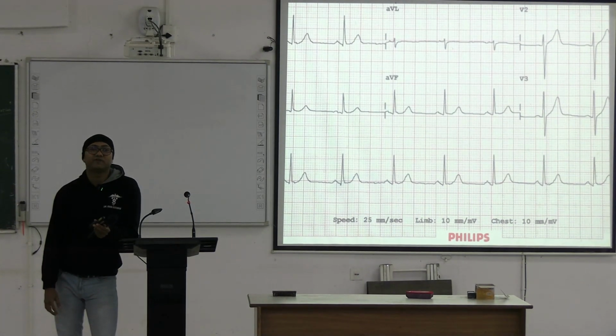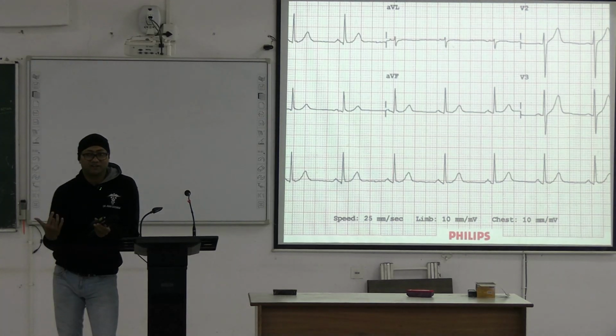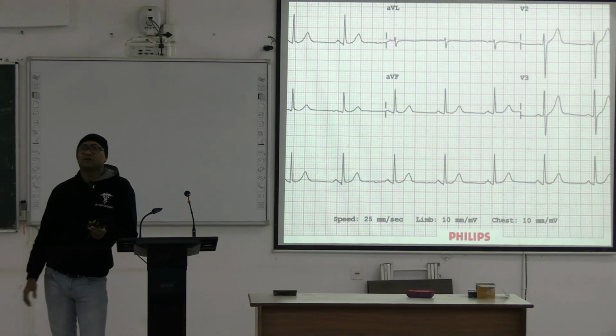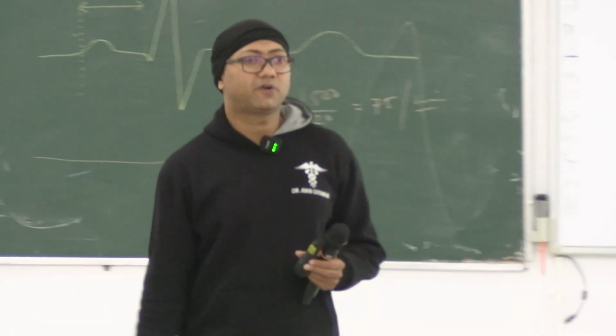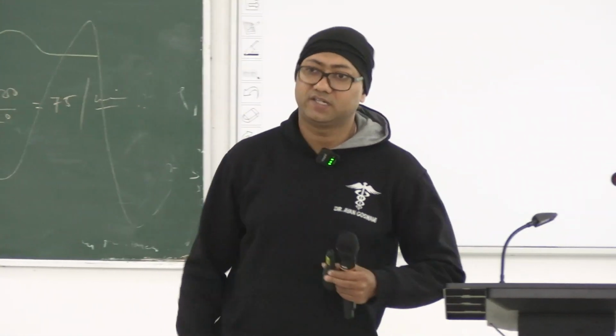Okay. In the exam we can give you a different ECG where the speed is 50 mm per second, then you need to divide 3000 by the RR interval. Then your formula will change, heart rate will be 3000 by RR interval. But conventionally for all ECGs, for all clinical practices we do ECGs at a rate of 25 mm per second, and you apply the formula 1500 divided by RR interval in terms of small squares, it gives you the heart rate.